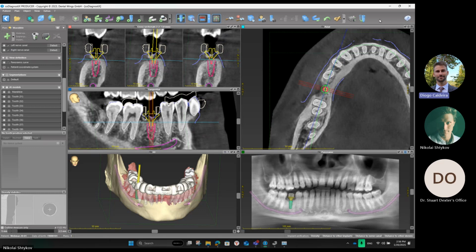I have a last question. You use the tooth using the Smile Cloud, right? Right. And the question is, can I use another tooth from ExoCAD or something like that? Can I export the STL of the tooth and use it in coDiagnostiX, or only use Smile Cloud? You can use code from everywhere, because coDiagnostiX is fully open software, and this is just an STL file. It doesn't matter where this STL file was designed. So you can export anything, whatever you want, from any software.